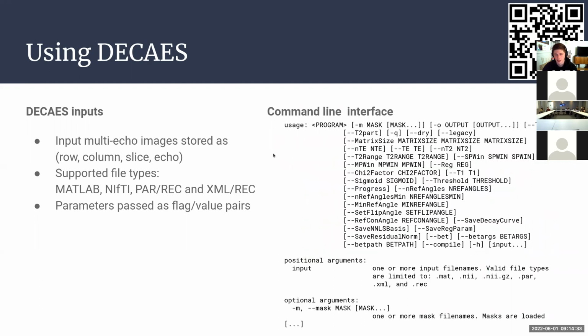Similarly, there's a command line interface, which looks very much like the MATLAB interface. There are a lot of arguments, and I encourage you to check the documentation to read about these, and we'll go through some of them later. But it's a very similar feel, and you can just run it from the command line instead of through MATLAB.